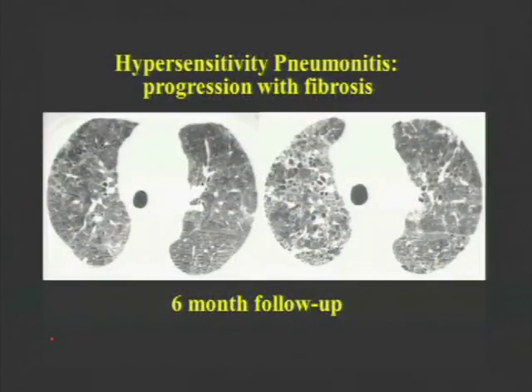On your left, you mostly see ground glass opacity with some patchy areas of mosaic perfusion. On your right, you can see fibrosis is developing with some traction bronchiectasis, perhaps even a little honeycombing, but the ground glass opacity is still visible. And notice that the entire cross-section of lung is involved. It's not subpleural predominant. And here we're looking at the upper lobes, where the disease is worst.